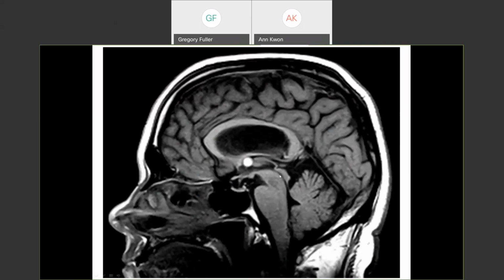The second thing is the two smallest structures in the midline: the cerebral aqueduct, and see how we can see it open from start to finish, and right here the infundibulum. It's a little bit pale at the bottom, but the pituitary stalk, the infundibulum, is tiny, and the cerebral aqueduct is tiny. When you can see both of those, you know that this is a mid-sagittal cut.